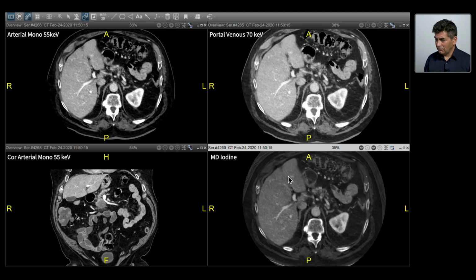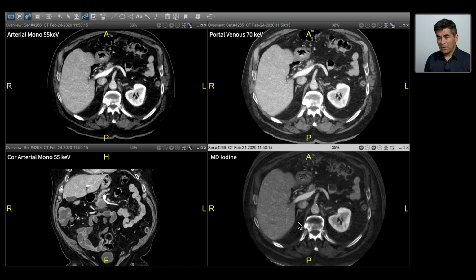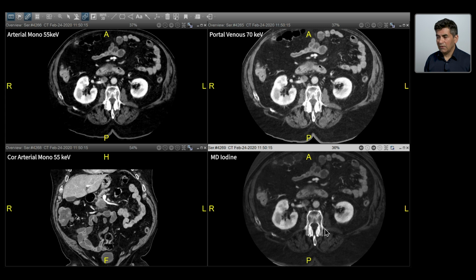Let's go to the liver lesion here. Now, what we notice, the liver lesion is not showing either a rim enhancement or heterogeneity within. That would have raised my concern for metastasis. Having not seen that, I feel confident this is an incidental benign finding like focal fatty infiltration, and I'm not going to order MRI in this patient. So I look for anything additional. I did not observe that.